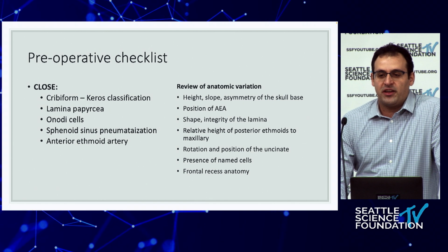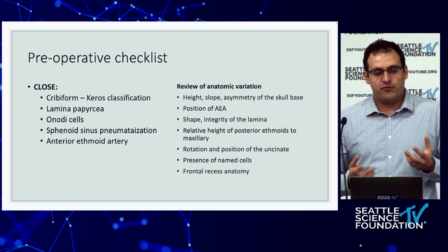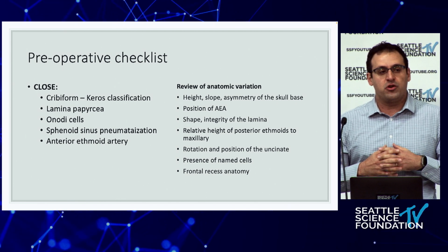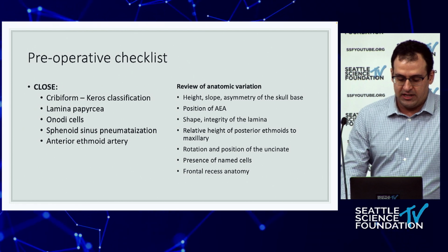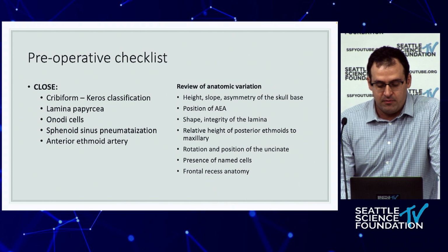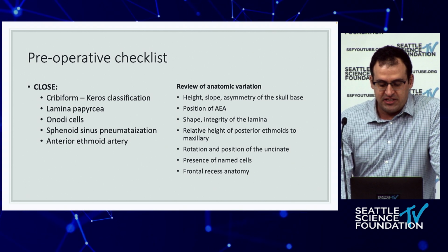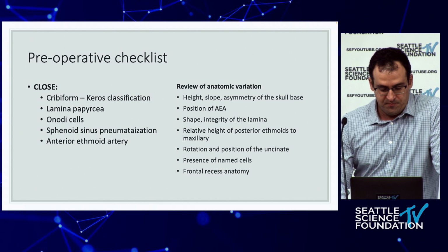And I think again, if you go to that basis that the sinuses are really preserved in everybody, you don't have to be so scared of things. Instead, you can look at how you can prepare to do full sinus surgery and make sure that you're understanding the anatomy of the specific patient so that you can get comprehensive surgery done. So I use this review of anatomic variation, which unfortunately doesn't have a nice mnemonic to it, but we'll go through each of these. I won't belabor it at the moment, but each of these is really important in preparation and allowing you to safely and efficiently move through your surgery.